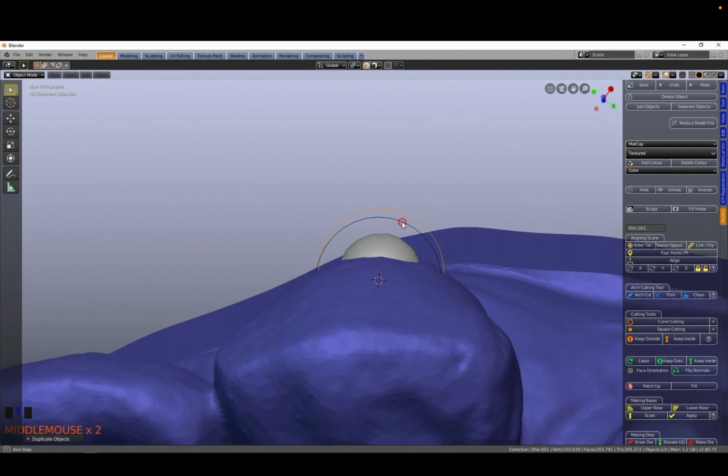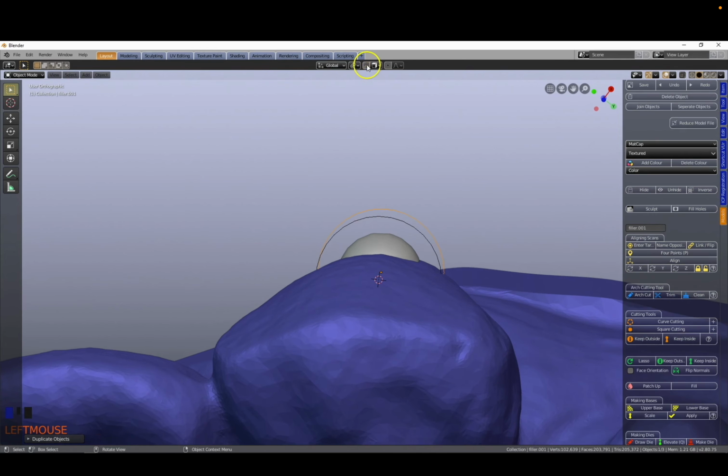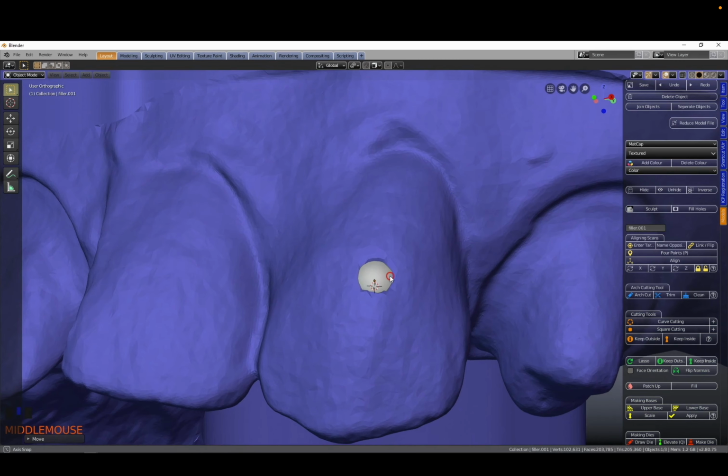If you would like to relocate the infill, first untoggle the magnet tool, select the sphere you would like to relocate. Press G to grab it, then simply move it to another location. Do the same for the other sphere. When you are satisfied with the outcome, press on Fill.